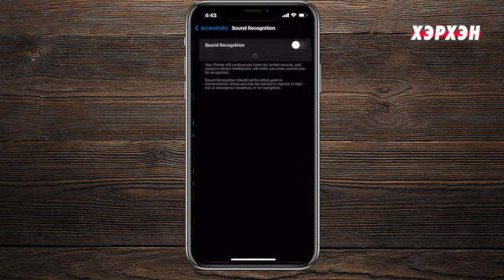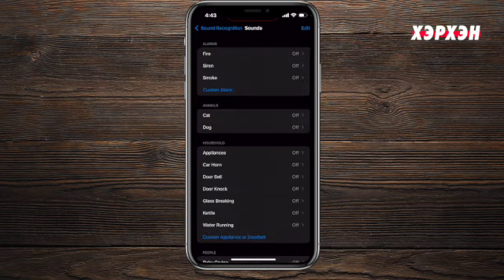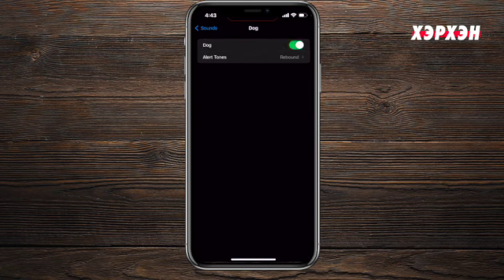You go to sound recognition and you activate it. When you go to sounds, this is the list of things it can hear and warn you about. So for your safety, you can turn on fire, siren, smoke, all of them. One of the things I do all the time is, I used to have a dog, so I would turn it on. Even if I might not be able to hear my dog in the other room, my phone or watch will tell me, like this. Ow, ow, ow. Sound recognition comes in and lets you know the dog is barking.